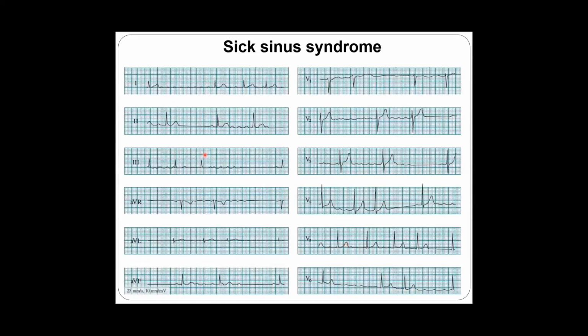Maybe you remember what I said last time about atrial fibrillation: arrhythmia absoluta, no P wave. Here we have arrhythmia absoluta, but we do have sinus P waves. You see the P in front of the QRSs, and this piece comes rapidly and then maybe nothing. So arrest and tachycardic and bradycardic sinus periods alternate.